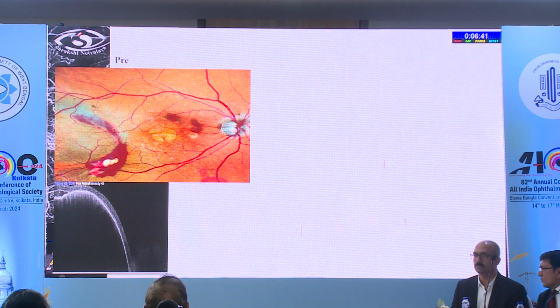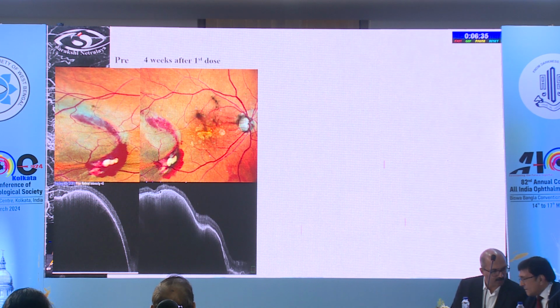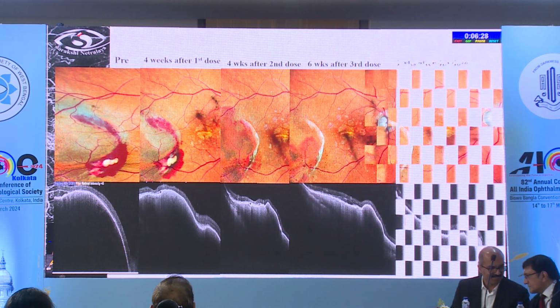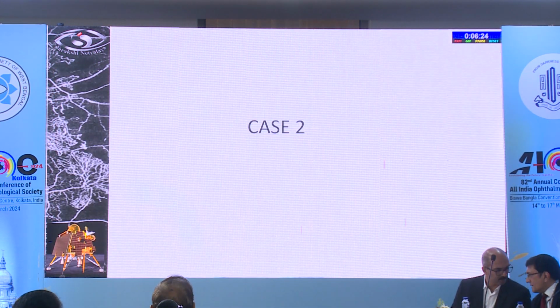In this particular patient, we treated with brolucizumab as a single modality of treatment, and you can follow up this patient at 4 weeks to see how the lesion is coming down, without any invasive investigation, and you could see how it subsided with proper treatment.